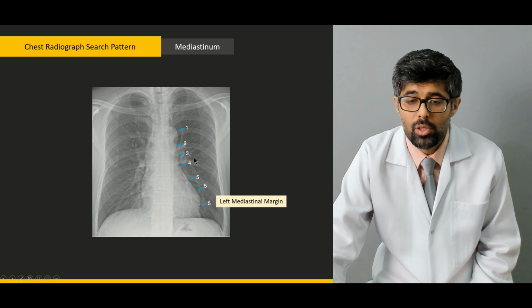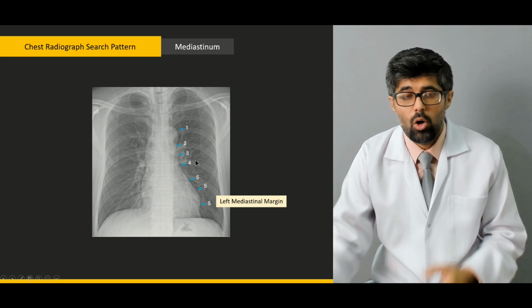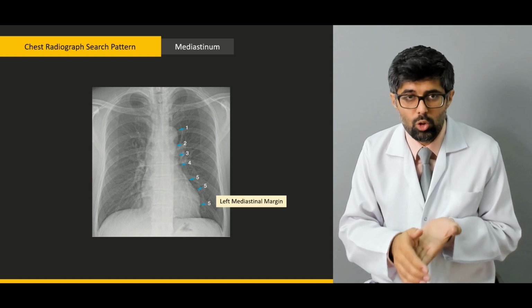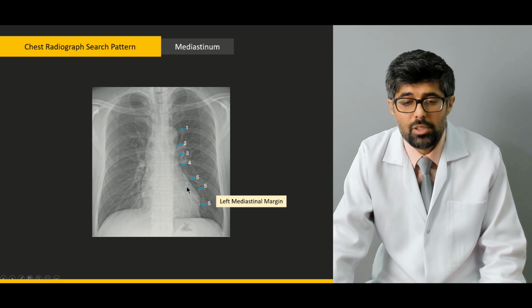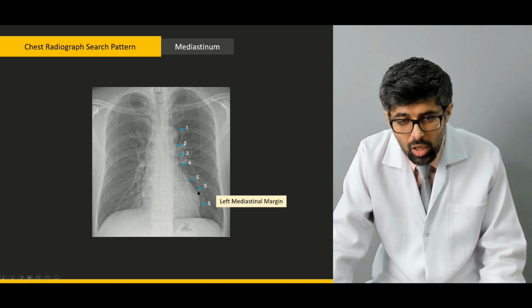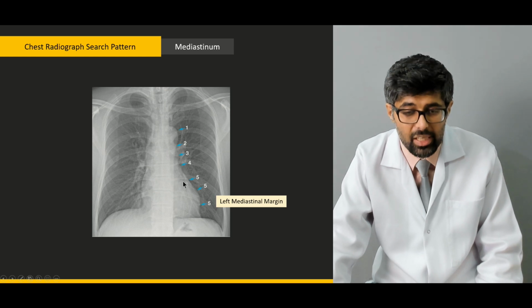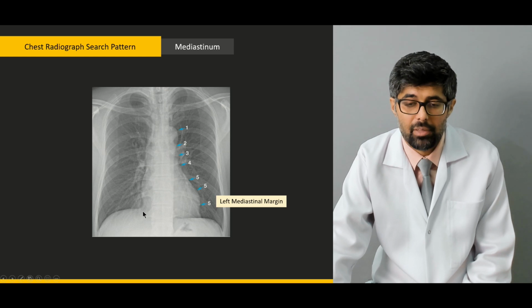Then at number 4 is the auricle of the left atrium. The auricle is actually the appendage or the extension of the left atrium, and it is normal. Then downwards we have the margin for the left ventricle. Now during heart sizing in cardiomyopathy and cardiomegaly, it is the left ventricle and this area that extends over the diaphragm.